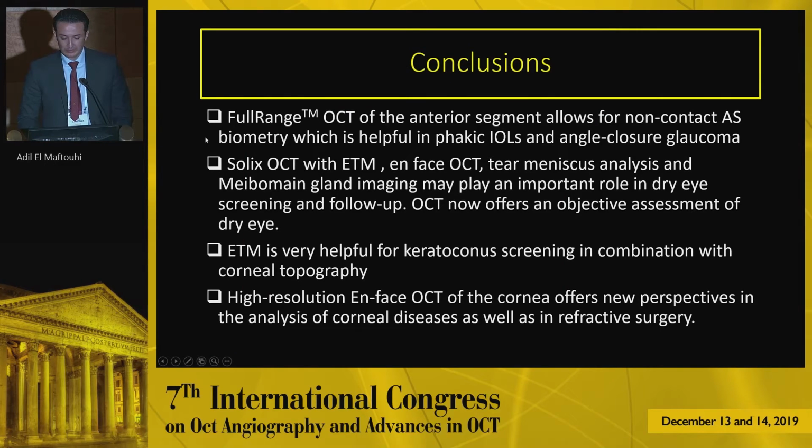So, in conclusion, full-range OCT of the anterior segment allows no-contact anterior segment biometry, which is helpful in phakic IOL and angle closure glaucoma. Solix OCT with ETM, en-face OCT, tear meniscus analysis and meibomian gland imaging may play an important role in dry eye screening and follow-up. OCT now offers an objective assessment of dry eye.